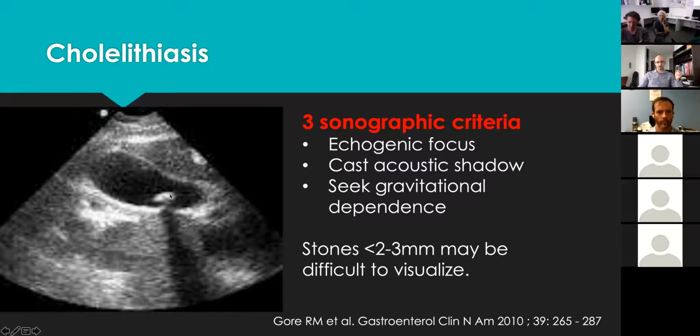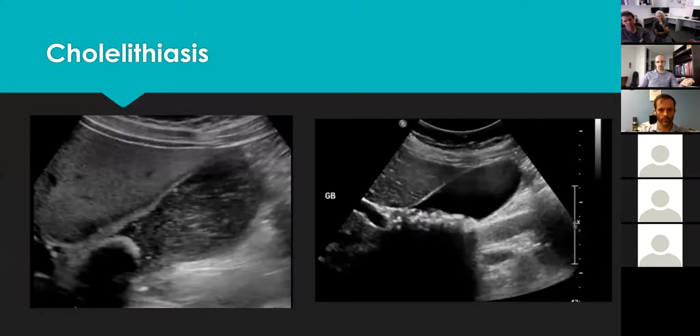For example, if you are searching actively for a possible stone in the gallbladder wall with all of those hyperechoic areas around it, and we don't know whether they are bowel gas or the stone, one technique is you can put the focus on the gallbladder neck to make sure that if there is a shadow, you would see the shadow of the big stone at least. Now, this is an example of a stone in the gallbladder neck, and you can see the big shadow after it. And these are multiple small stones. So it's mainly a mix of small stones and probably sludge in between.